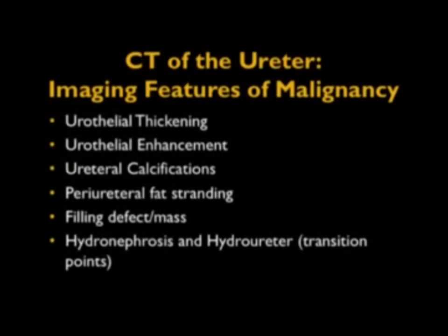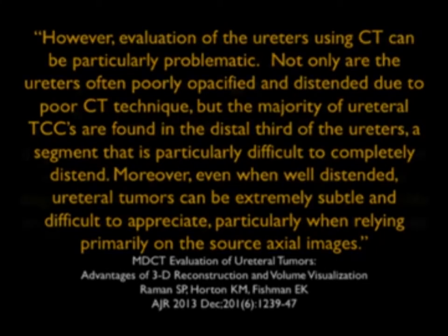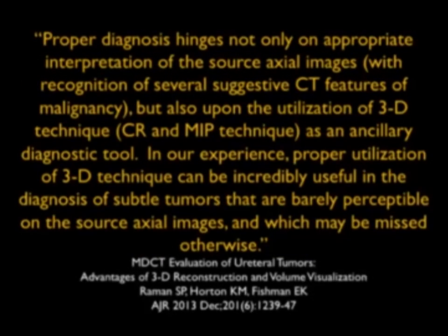Now, there are many imaging features of the ureter: thickening, enhancement, calcifications, fat stranding, focal filling defects, and hydronephrosis, but it is somewhat challenging when it's very, very minimal. This article by Rahman and Horton talked about how it's a very challenging area, that proper diagnosis hinges not only on appropriate interpretation of the axial slices, but in the utilization of 3D imaging. In our experience, proper utilization of 3D can be incredibly useful in the diagnosis of subtle tumors.